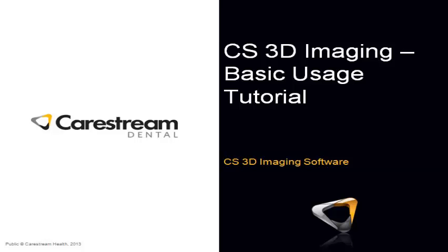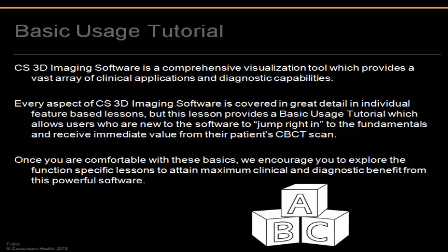This lesson will provide a basic usage tutorial for CS 3D imaging software. There are very detailed feature-specific lessons available for every aspect of CS 3D imaging, but this lesson will allow new users to jump right in and become familiar with the software basics.